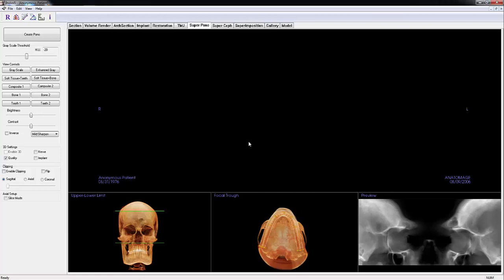The purpose of the SuperPano tab is to reconstruct the panoramic image of the scan. With superimposition options of the SuperPano tab, we can apply 3D volumes to the pano to see additional structures and make superior panos. By nature, a pano is a 2D representation of a 3D object, so there will be a degree of distortion.